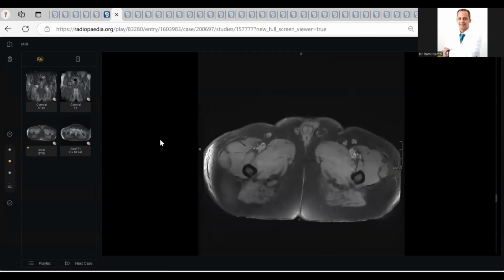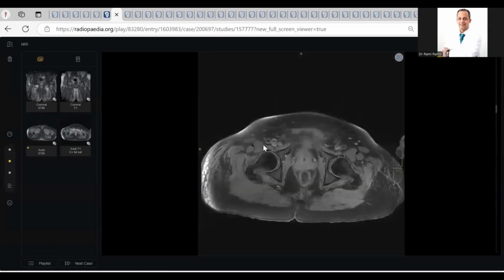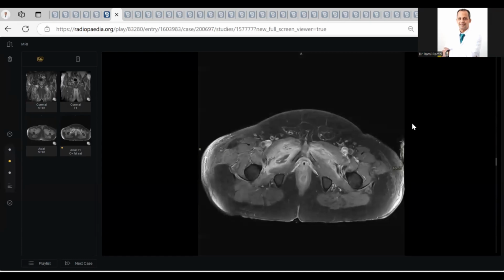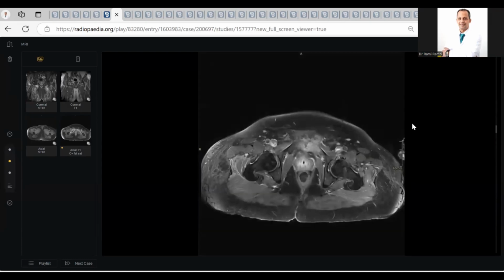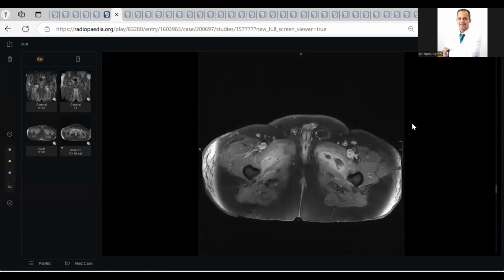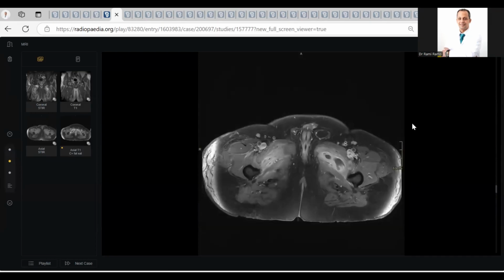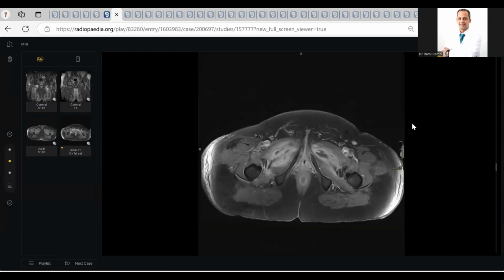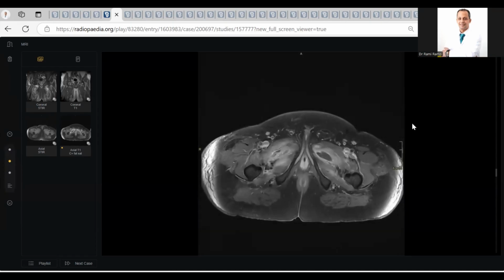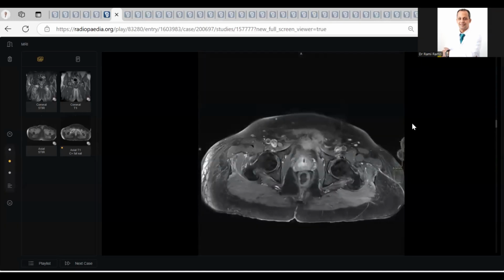This is MRI of the same patient. Okay. You can start. Yeah, there are intramuscular abscesses noted within the bilateral adductor muscles. There are fluid collections that are intercommunicating and peripherally enhancing. I could not appreciate any signal within the bone.